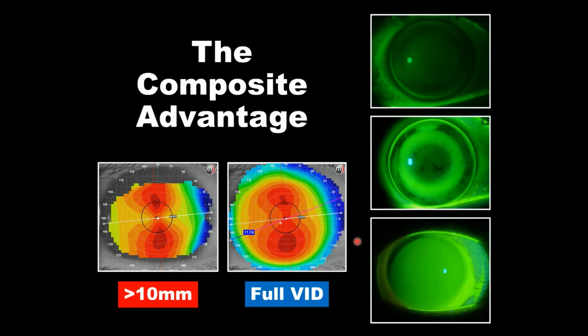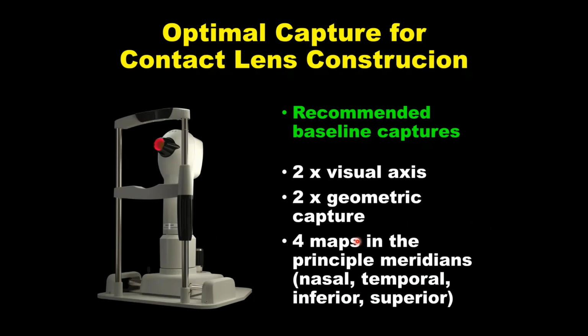Now, Medmont created a capture wizard for the composite capture, but I want to tell you something kind of crazy. I don't use the composite wizard. Now that I understand what Medmont wants as a way to link the various fixations together, I actually do something kind of different. So I want to share with you what that is.